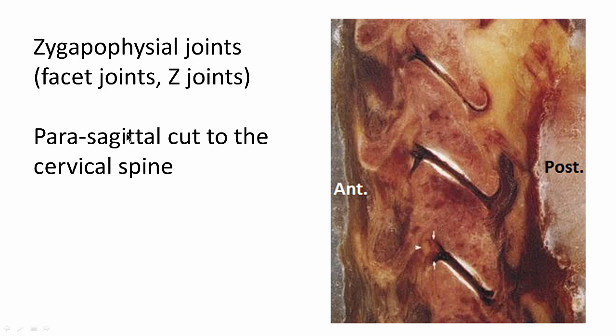So here's now, what's a parasagittal cut? A straight sagittal cut is right through the center of the spine. It's like if a samurai warrior jumps out in front of you with his sharp blade and is staring you right in the face, and then he cuts you through the crown of your head, through the tip of your nose, down the sternum, through your belly button, and your trunk, just like a cartoon, falls to the left and right. That's a perfect sagittal cut. Now if the samurai warrior cuts you through your eyeball, and maybe between your sternum and your nipple, see, it's a little off center, right? That's a parasagittal cut.